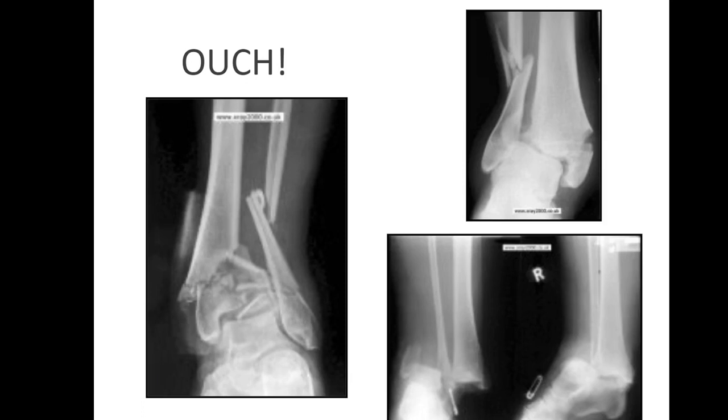All right, let's take a look at a few additional lower extremity fractures.